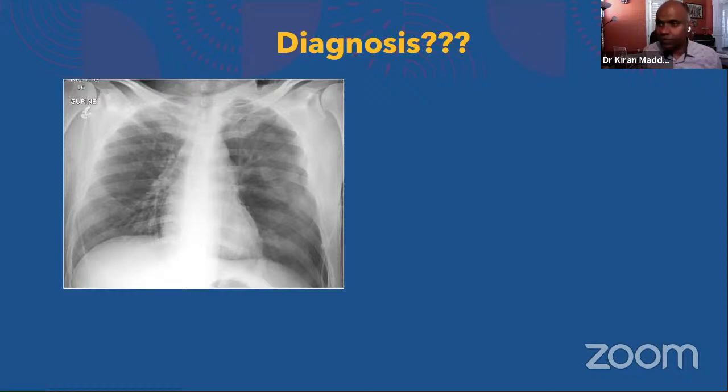And if you're still not getting it, go to the periphery of the lung. Still, I don't see any. So I have to reveal the answer for you. Now, are you able to see it and comment? Very common diagnosis. Finally, I see some answer. Very good, Salim. Good job, Salim.